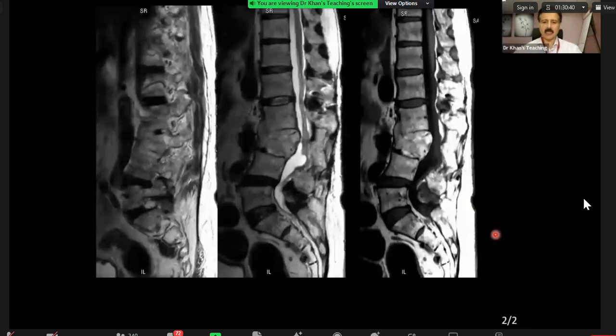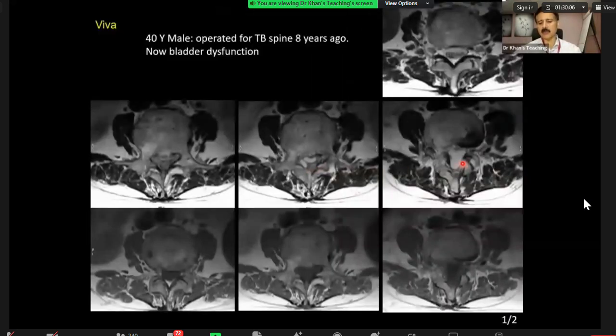So if you see this, of course, this has got treated TB here, and look at this, you have to develop your eyes, because this is a very important exam case, and I'll show you multiple examples of this, where clumping or thickening of the nerve roots on a T2 weighted sagittal will appear like this, and the examiner is going to open the case on a T2 sagittal. Once you pick it up, then you ask for axials. Here, that slice was going through at this level actually. And you picked up the finding very well.